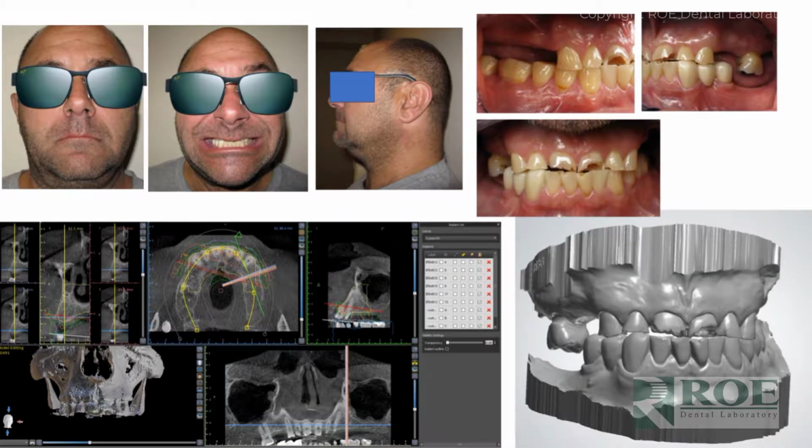This video will share the workflow of a standard CHROME GuidedSMILE case. This case has a few highlights, including discussion on the smile, on the injection ports, and on the specific photographs for CHROME GuidedSMILE. As with almost all dentate cases, this is how the records are sent.